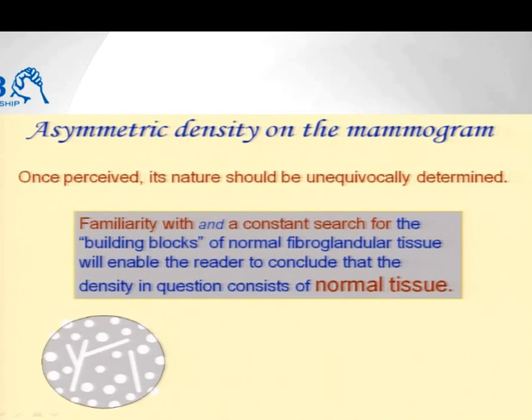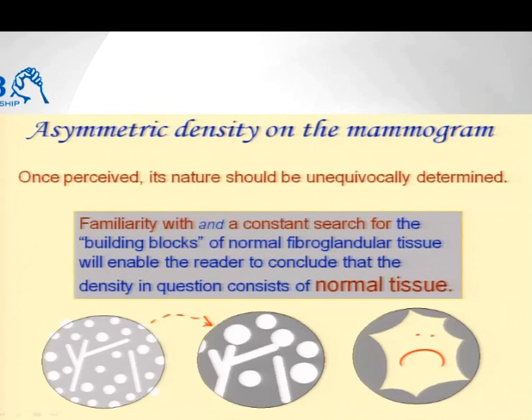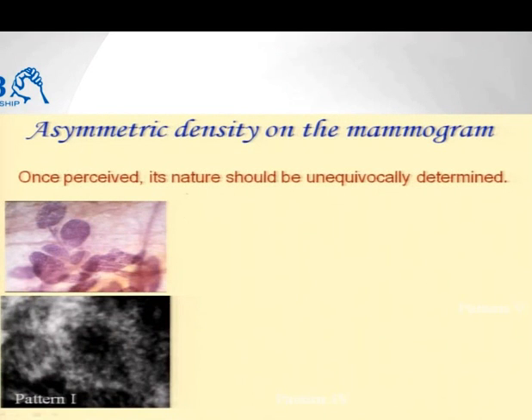Normally it looks like this in a schematic drawing, or when it's adenosis, then it's larger, or this is what we certainly dislike, fibrosis. And in reality, this is what we are imaging, the three-dimensional subgross histology image. And when you put an X-ray tube above it, as we do, and we call it a mammogram, this one, the milk factory, measures about 1 to 1.5 millimeter in size. Why can I see this one separated from this one and that one? Because there is fat among them. And here we see the ducts as well.